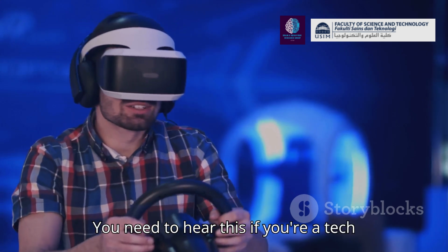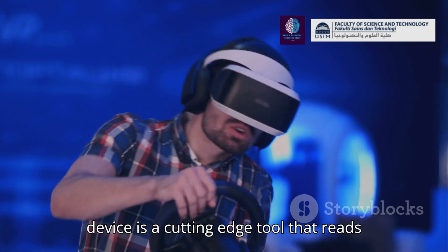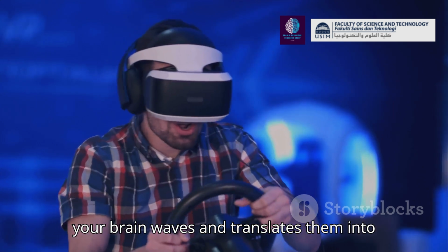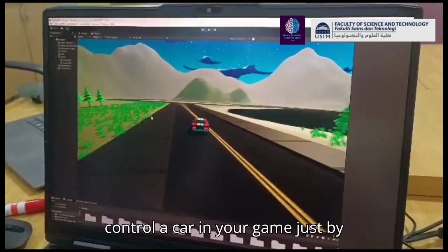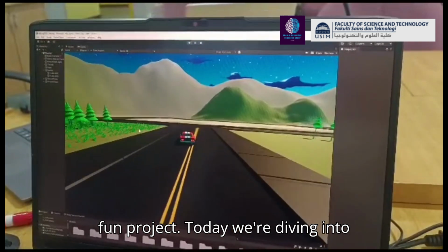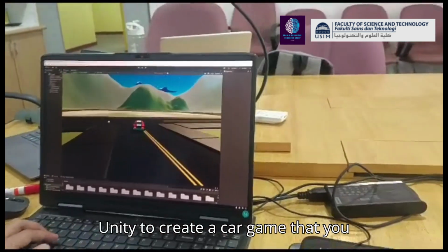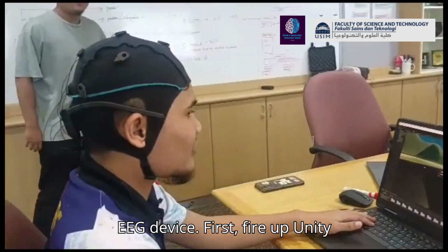You need to hear this if you're a tech enthusiast. The Unicorn Hybrid Black EEG device is a cutting-edge tool that reads your brainwaves and translates them into commands. What if you could control a car in your game just by thinking? Let's turn that fantasy into a fun project. Today, we're diving into Unity to create a car game that you control using the Unicorn Hybrid Black EEG device.